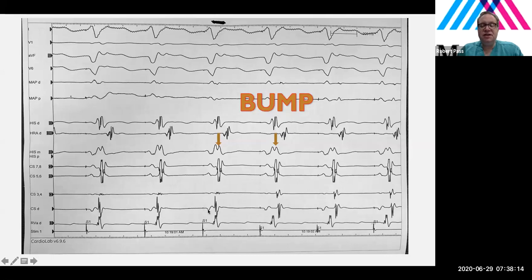Over here, we see the difference. In this case, it was from catheter bump, but it could also be from ablation. The delivery of radiofrequency current could also cause this to happen. In fact, that's the most common thing. So anyway, I thought I would just share the case with you, since Uzo was the only person who had the opportunity to see it last week.